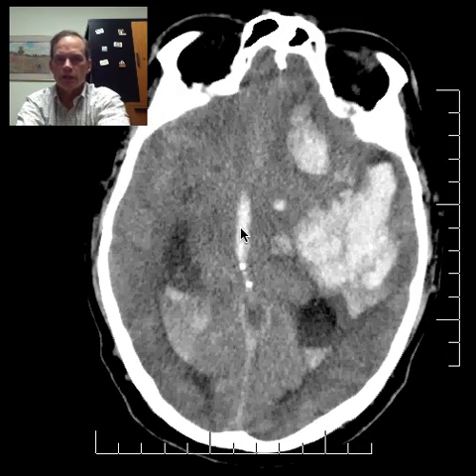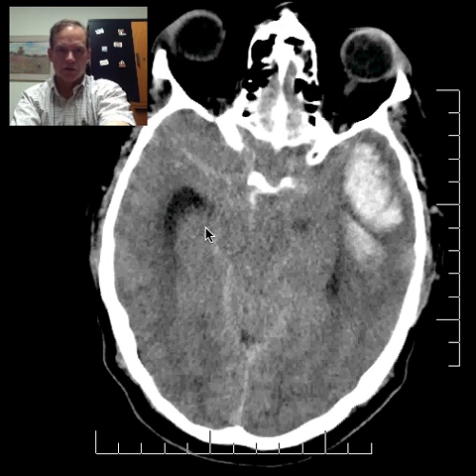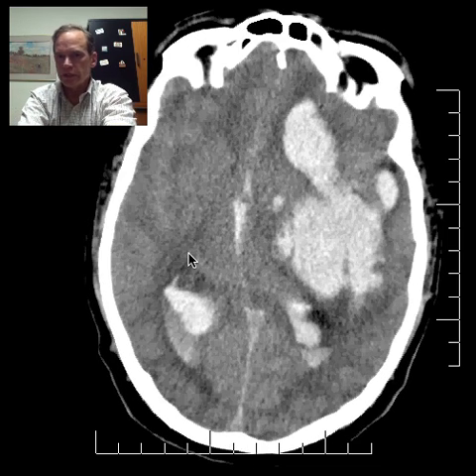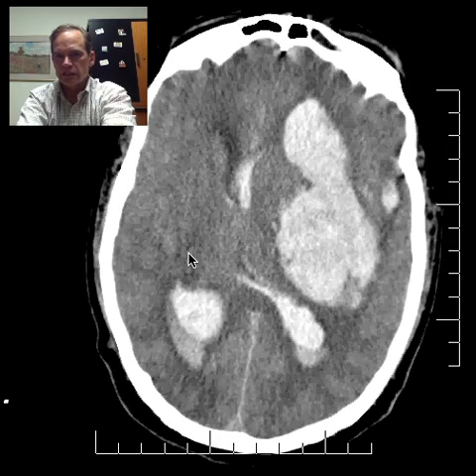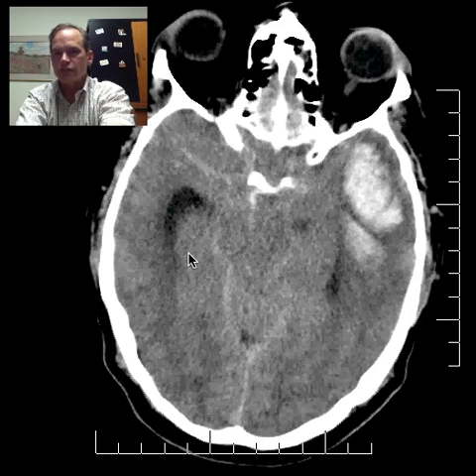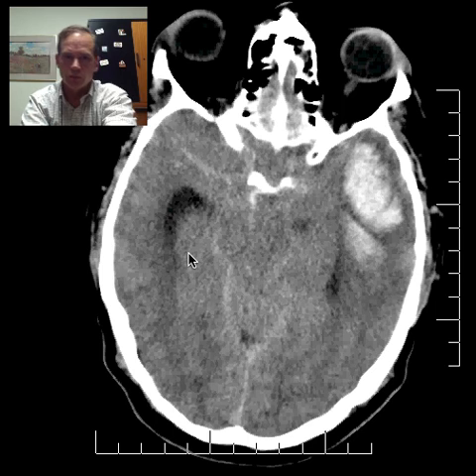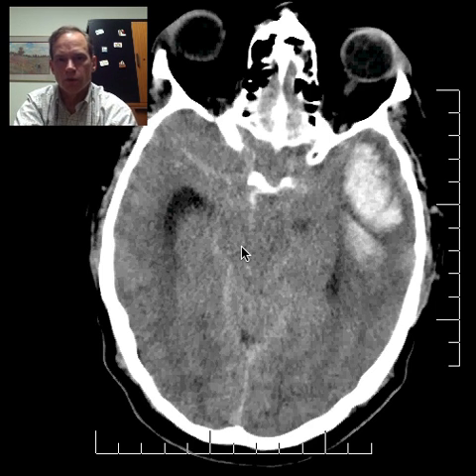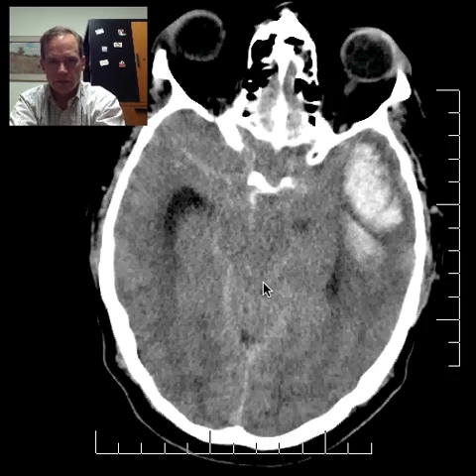People call it trapping of the ventricle, because the ventricle is still going to be producing CSF, and some of it will probably be getting through, but there will be an accumulation of pressure in that side because the CSF has nowhere to go. Plus, even if it weren't making CSF, the amount of midline shift is compressing the ventricle that is trapped. Okay, so that's important.